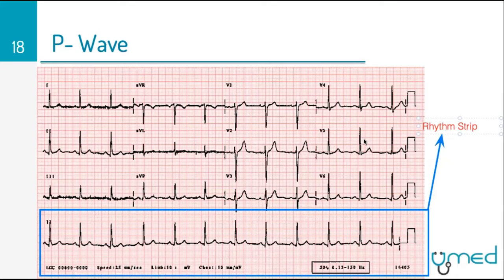And I'm gonna come to it, but basically when you first start looking at a 12 lead ECG reading, look on your rhythm strip first. So here we can see P waves. Like we see a P wave here. Well, no, that's not a P wave. That's a T wave. My bad. We see a P wave here. We see the QRS. We see a T wave. P wave again. QRS, T wave, P wave. Right? That's a rhythm strip.